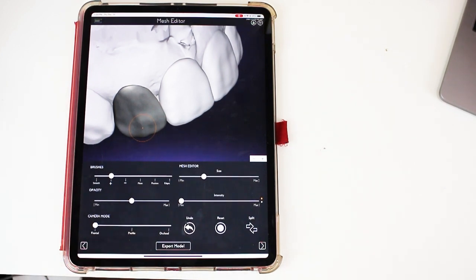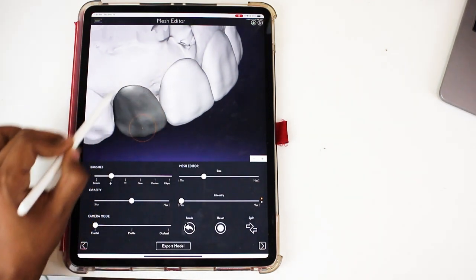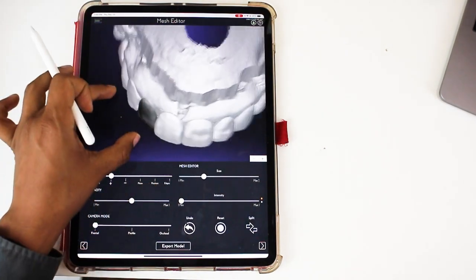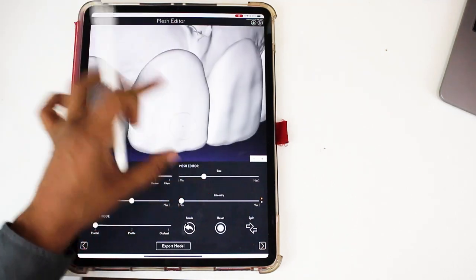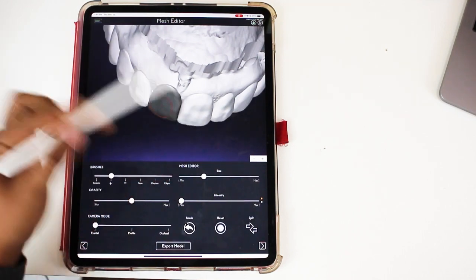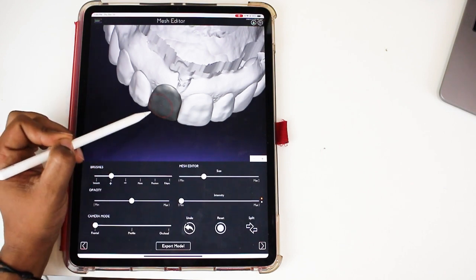Let's say if you are thinking of doing a gingivectomy using a bisacryl as a guide, or if you're thinking of sending it to your lab so they can create a gingivectomy guide, the highlight of that zenith will help you or the dental technician to better perform the guide for your dental procedure. Notice that here you're able to see final details of the design as well, and the same design later will serve as a guide for your future restorations.